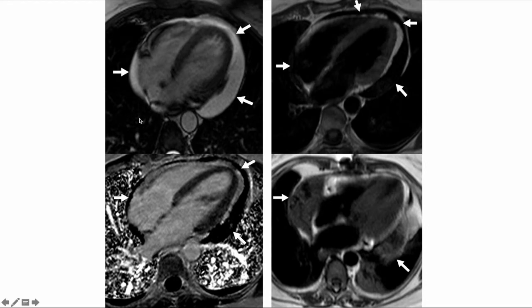This slide shows us how pericardial fluid can look in different cardiac MRI sequences. The first image is a white blood T2 weighted image where the pericardial fluid is depicted as very hyperintense. The second image is a T1 weighted black blood image where the pericardial fluid is very hypointense. The third image is a late gadolinium enhancement image or PSIR sequence wherein the fluid is shown as a very jet black area. So this is how a transudative pericardial effusion will look on different sequences.